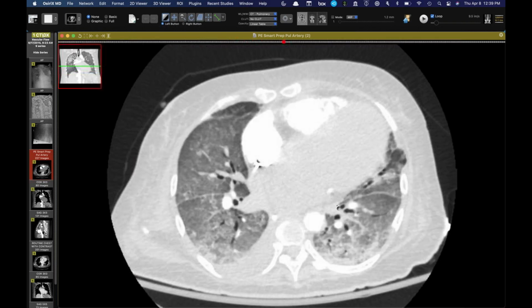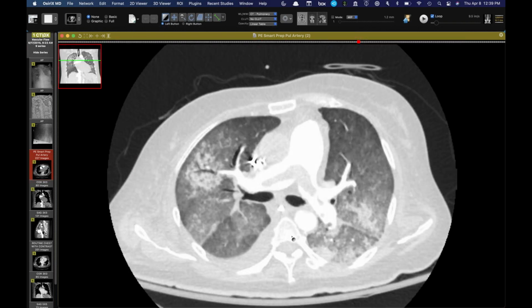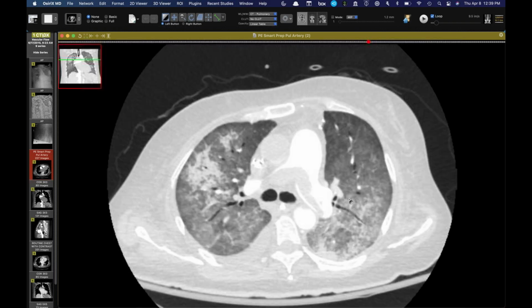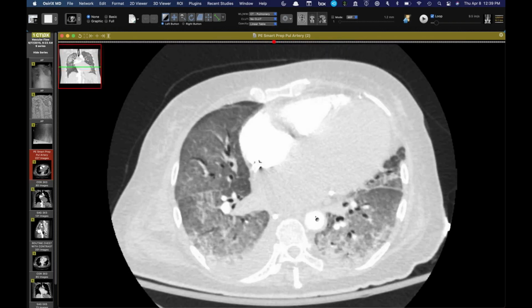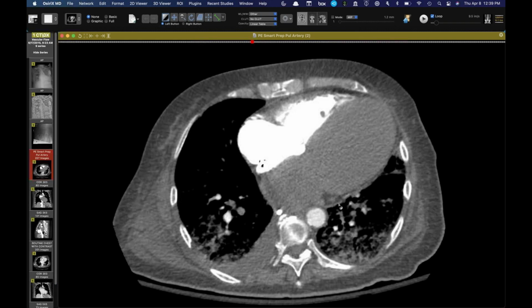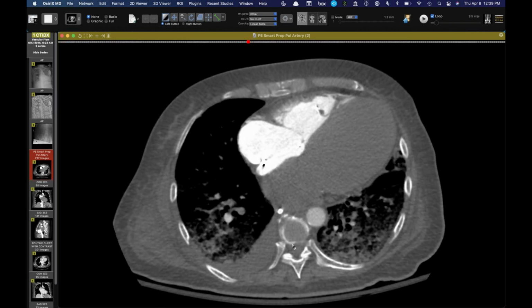And this one's very similar. Or actually, I don't know. I hadn't looked at this guy's lungs in a while. This one looks like it's more chronic. He's got some lung injury here. I'll have to look back at that. But just two examples of bizarre flow from veno-arterial ECMO.